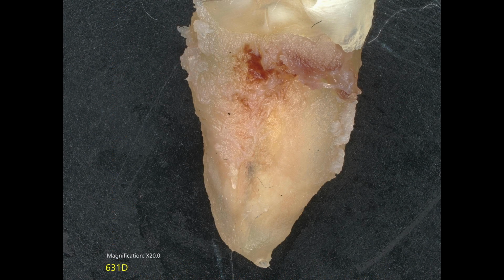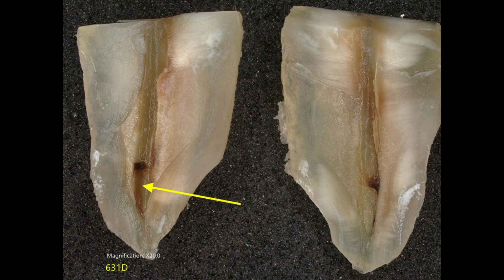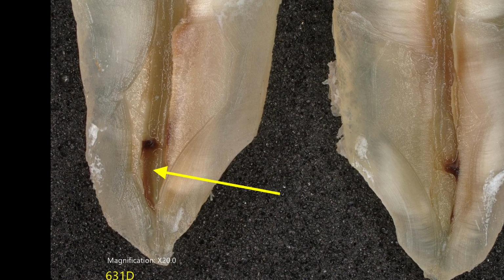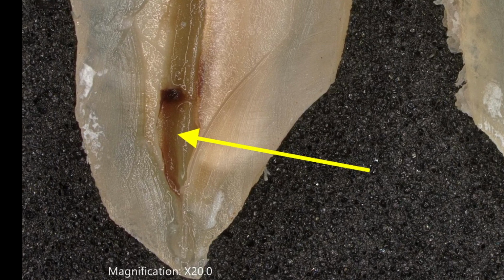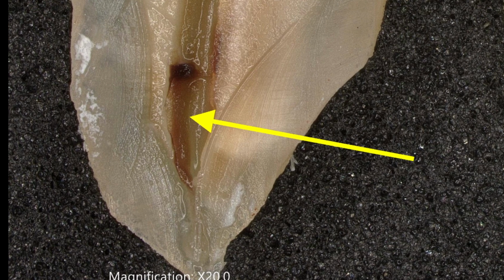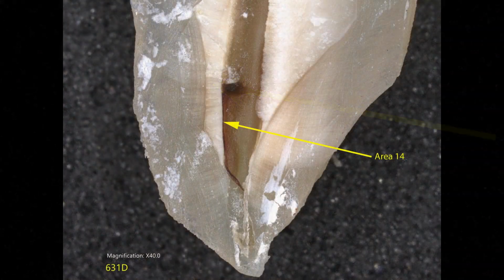This is the section distal root as we received it, and this is the sagittal split of the root, as is our method. The root was split into two halves, and the canal terminus was visible in both halves. The single canal appeared very well debrided, although there appeared to be a pulpal stump of tissue still remaining in the apical section of the root that appeared to be of hematogenous origin. We will first examine the apparent pulpal stump.